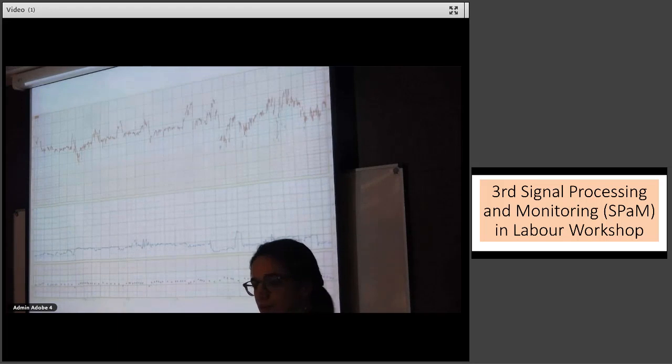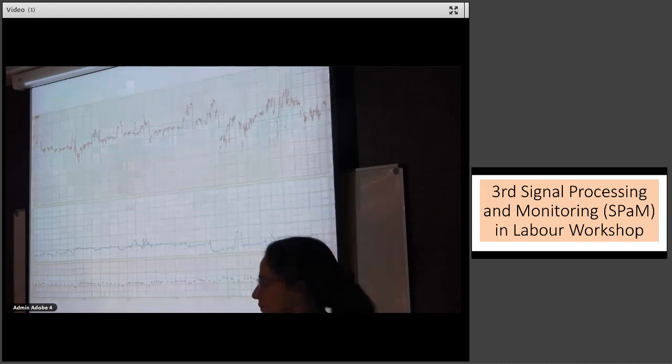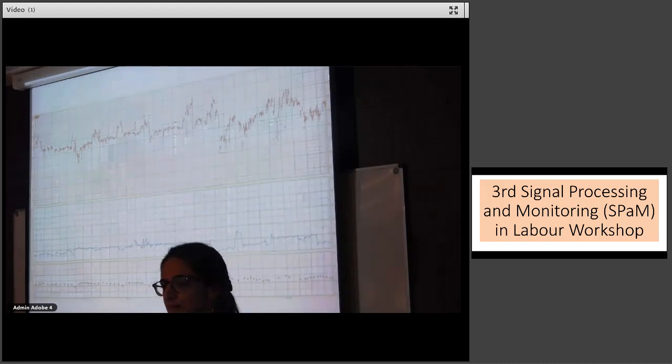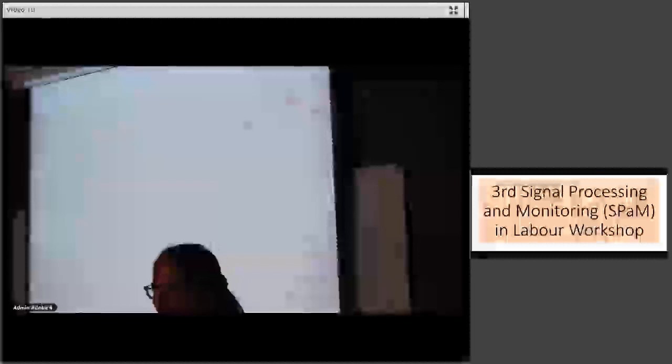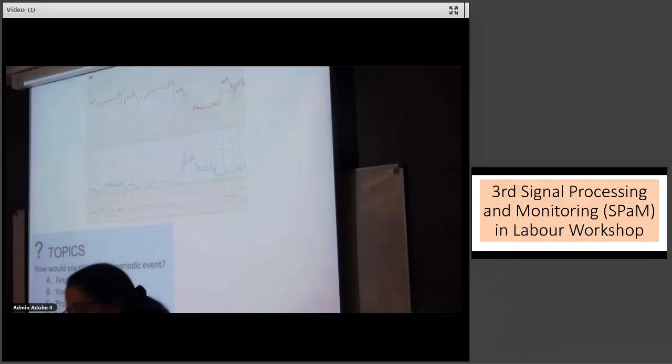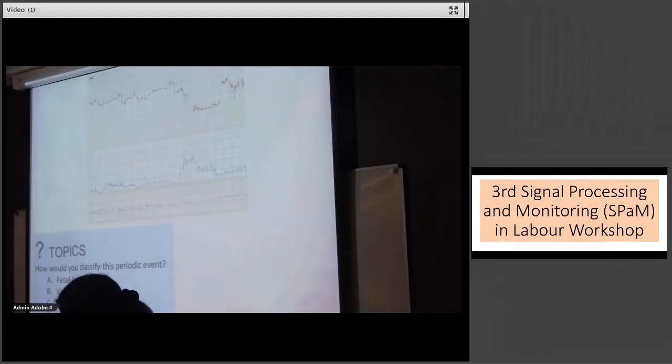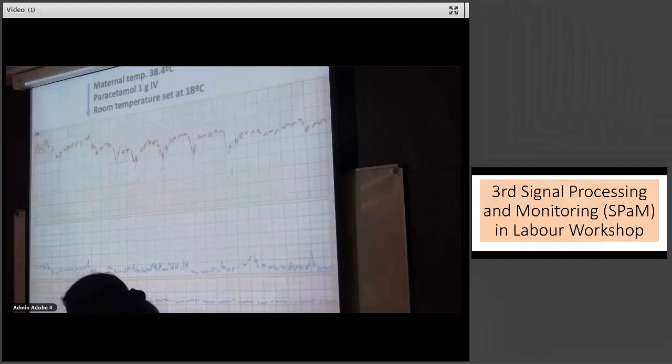Fine. Austin, would you like to comment on this relationship? I've got one question and then one comment. My question is, does anyone know what the mother's baseline heart rate is? That's one of the major questions here, especially after the discussion that we had before. If you go 2 frames back or 1 frame back, next one. Yes.